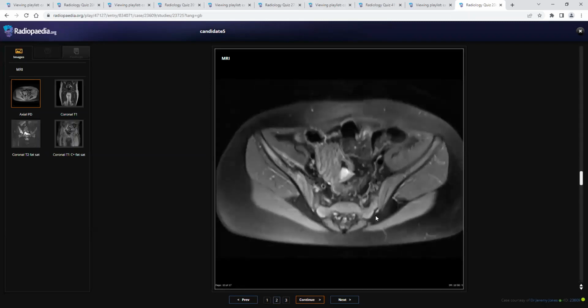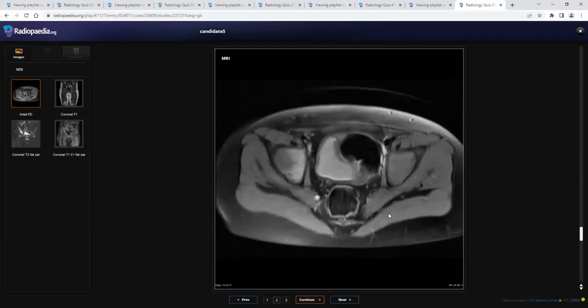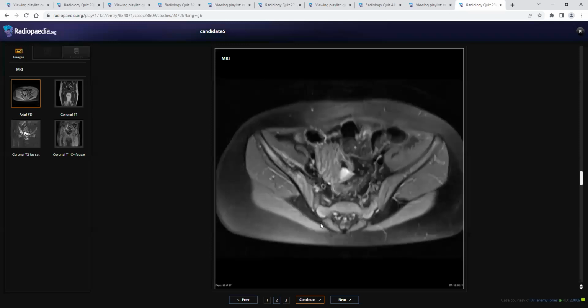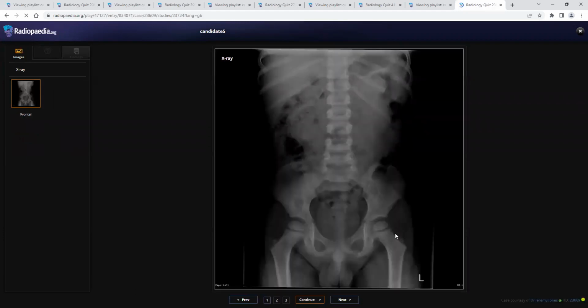After that, you rightly picked up this is a right iliac bone lucent lesion in a child. This is a case of Langerhans cell histiocytosis. Differential diagnoses of metastasis and Ewing sarcoma are less likely. I was thinking that the left femoral epiphysis was also smaller. It may be apparent, but the patient's symptoms were on the right side. You should go with the patient's symptoms.